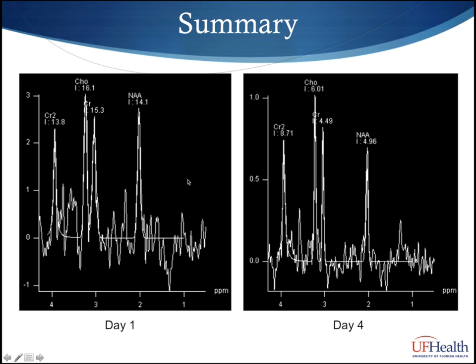So spectroscopy imaging does reveal that on day 1 there is a small lactate peak, but otherwise normal. By day 4, the lactate peak has resolved, and we can easily see that this lipid peak here could be confused for lactate if you were using a short echo time and were expecting a positive lactate peak. Day 12 was not included as it had a similar normal appearance.